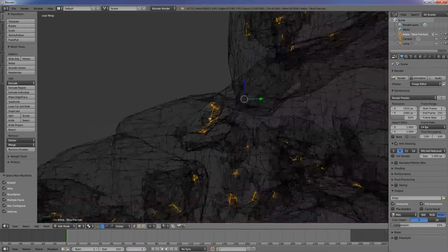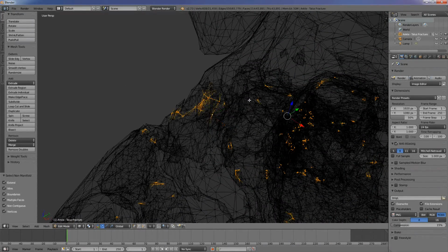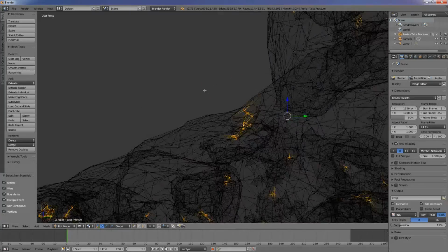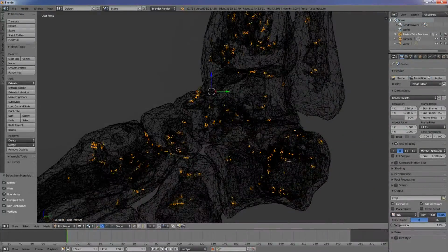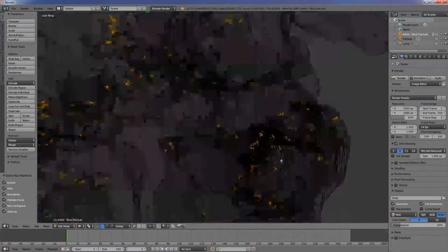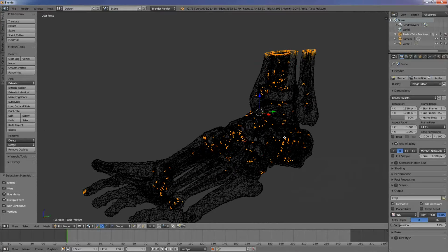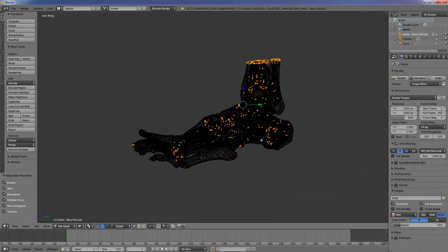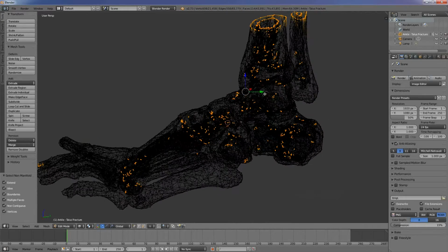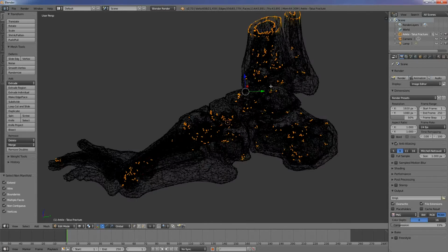You can zoom in on just some of these, and you can see how complex the mesh is and how difficult it would be to repair all of these defects. Fortunately, there's a way to work our way around this so that we can repair all of these defects within a couple minutes. And I'll show you that a little bit later on in this video.